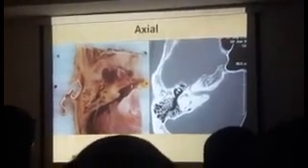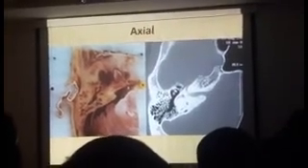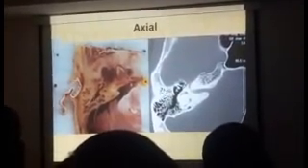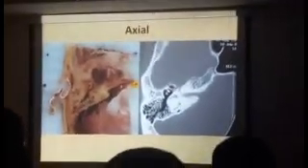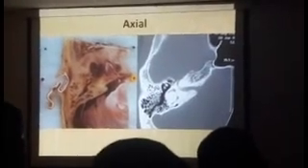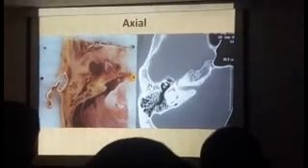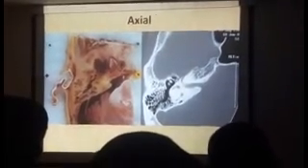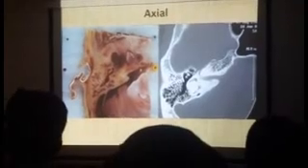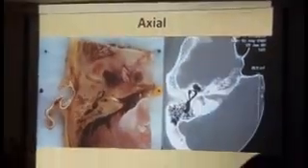Not only that, right anterior to the head of the malleus, you see this bony septum, which we all know as the cog, right? And in fact, that is well correlated here on the gross specimen as well. And you do have a cell anterior to the cog. So in a way, the scan helps you in understanding the fact that beyond the cog there could be pathology. If you take this cog as the end point of your dissection during surgery, you could land into trouble, leaving behind residual disease. Anyway, so you see the head of the malleus, the incus and the incudomalleolar joint.